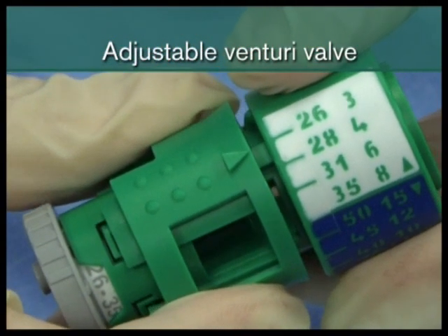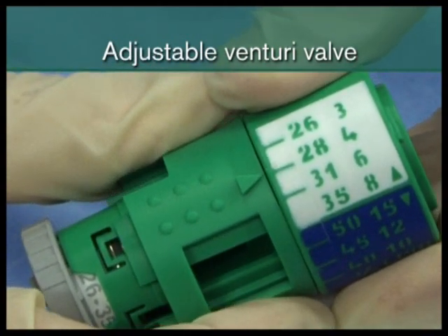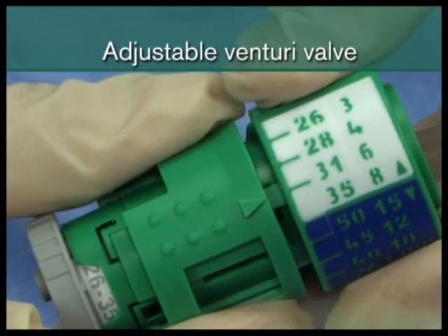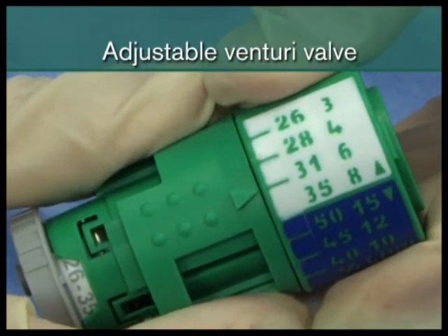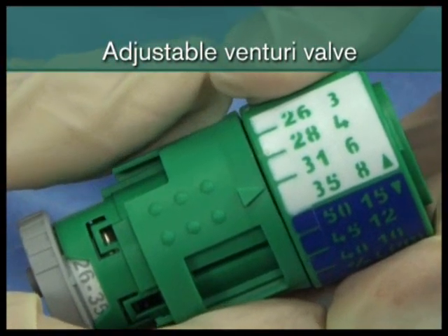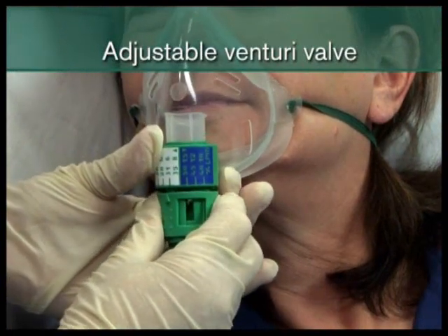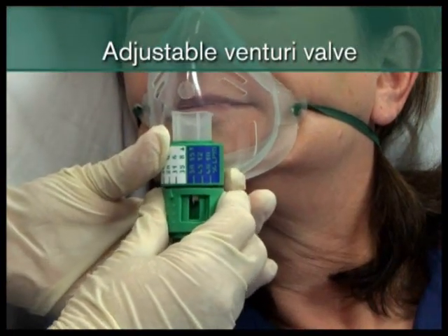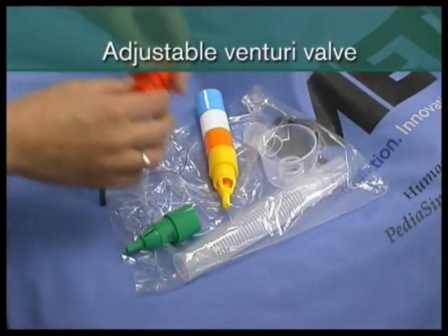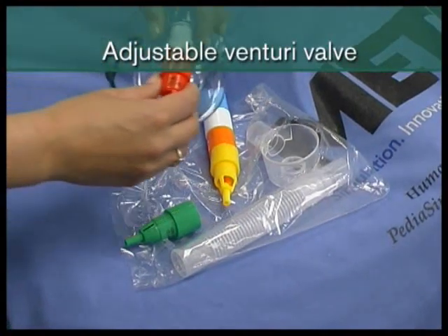With an adjustable Venturi valve, the rotation of the sleeve increases or decreases the size of the air entrainment window. This in turn changes the oxygen concentration. This means that the same valve can deliver a wide range of concentrations. As the valve does not have to be replaced each time the prescribed oxygen concentration changes, the changes can be made quickly. It also means that different valves do not have to be held in stock by the hospital.